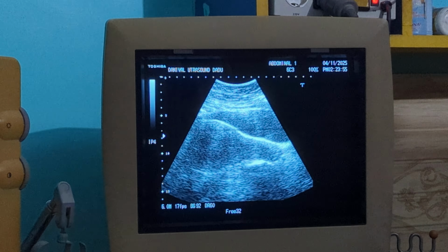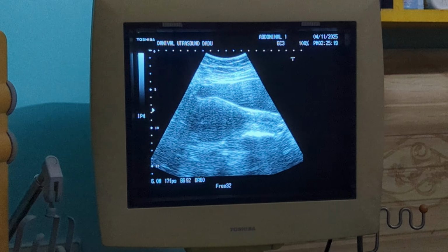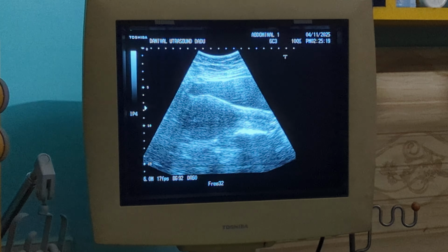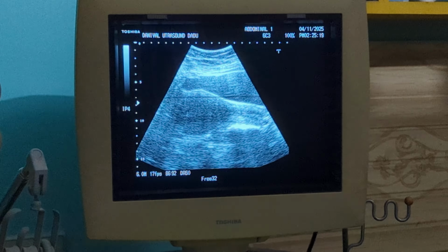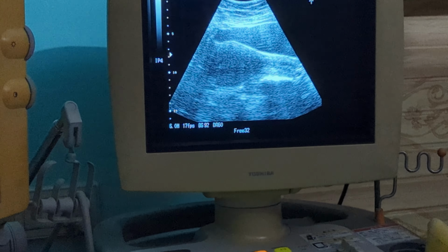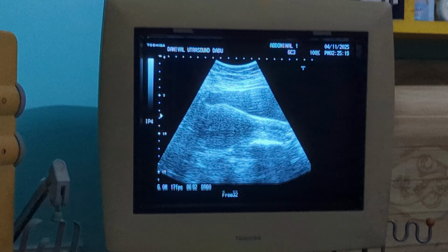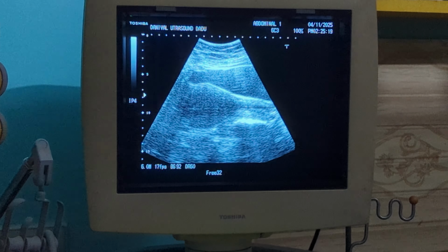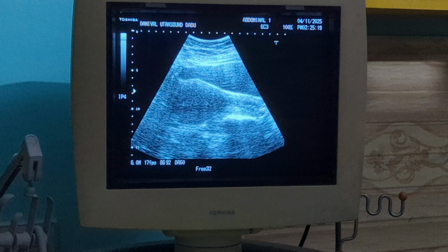In past videos, I have told you that fibroids are usually well-circumscribed, round, hypoechoic masses with edge shadowing, and sometimes they show calcifications. But adenomyosis, on the other hand, has no definite borders, a diffuse heterogeneous pattern, and small cystic spaces spread all over the myometrial tissue. Also in adenomyosis, the uterus looks globular and soft, while in fibroids it may look lobulated or nodular.